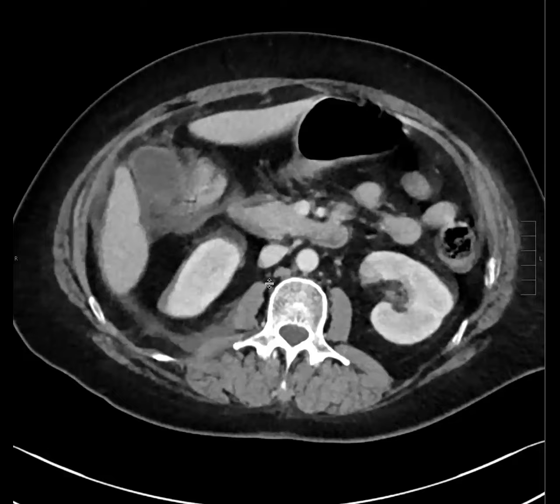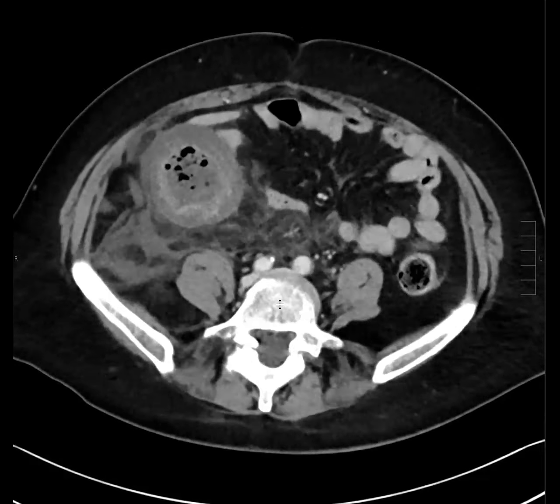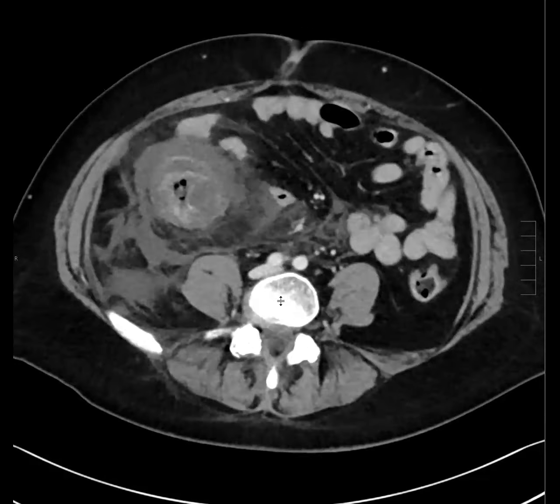This is the patient who's neutropenic on chemo for leukemia. It's a really great example of this process. I'm thinking typhlitis. So neutropenic colitis. Here's a venous phase. Typhlitis with intussusception. And wait, the mucosa is like breaking down. The wall is breaking down.